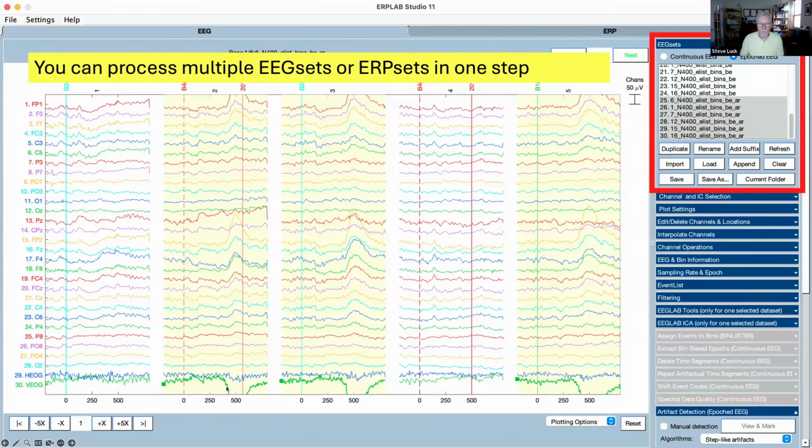beginning of the waveform. By the way, we put a little blank period between the epochs so that it's easier to tell where one epoch ends and the next one begins. That was always a minor annoyance in EEGLab.